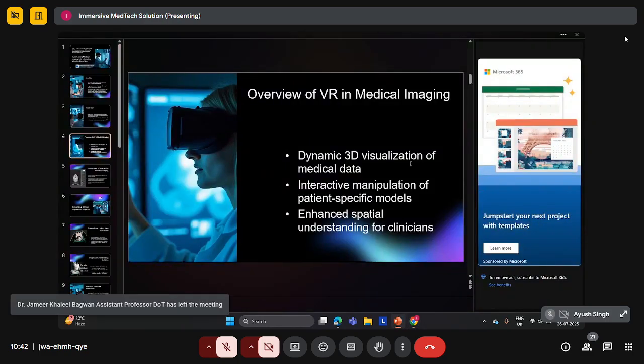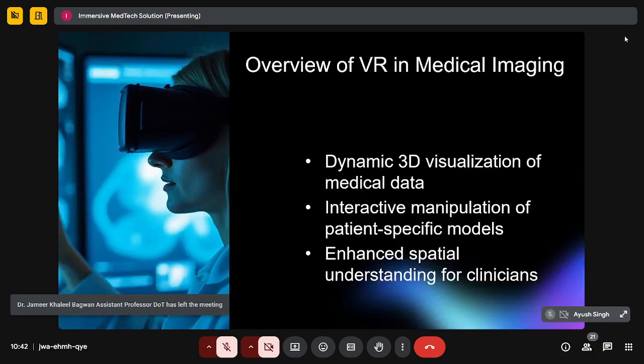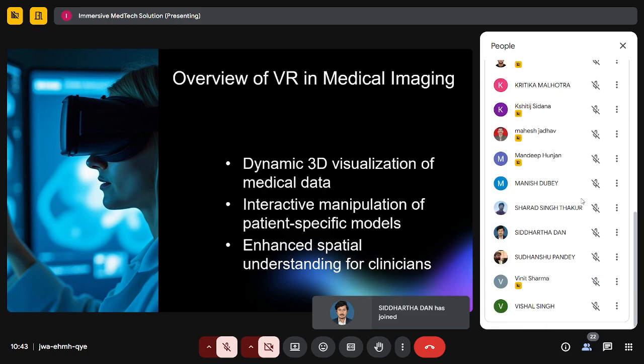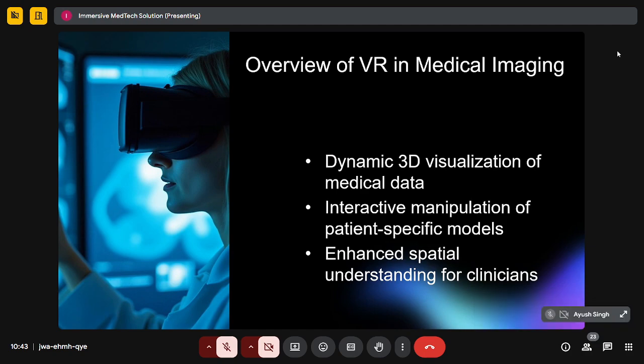Apart from this new approach of using the software in VR, we are also given an added advantage in Elucis to directly operate the software in a desktop-based environment. So if we are familiar with the desktop and don't have a VR headset, it's not an issue. We can operate the software in the normal desktop environment, like our laptop or any computer that we have.